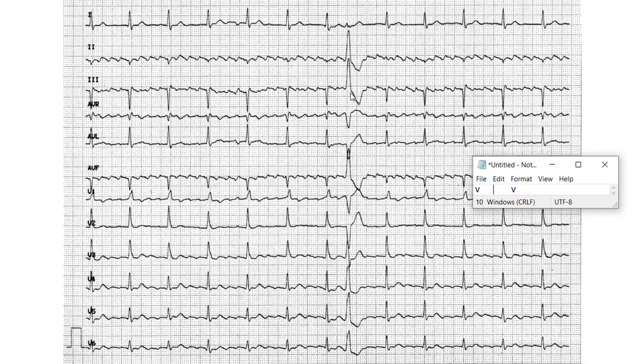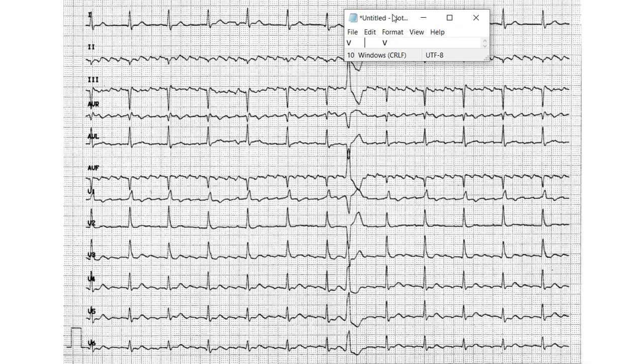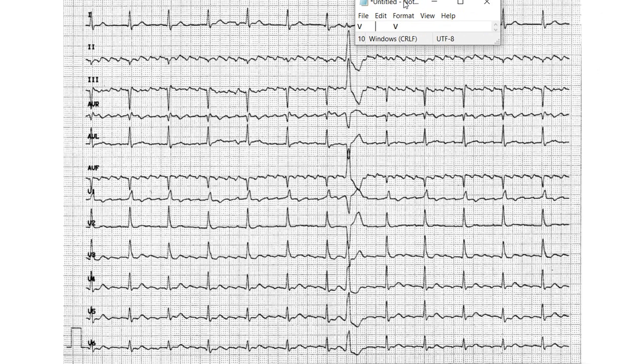With the mouse here, you see that there's an extrasystole. So technically speaking, this can also count as regular rhythm with a singular extrasystole. Give me just a second, because I don't want to mess you guys up. I've got my ECG in front of me. Yes, it's regular with a singular extrasystole.